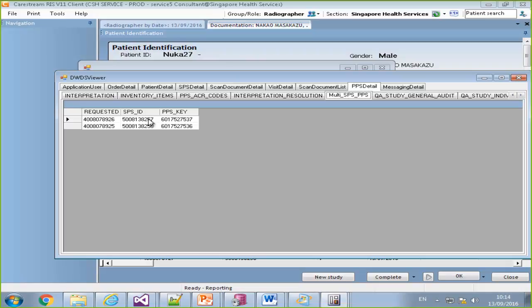In a lot of cases, the ones this is really important for, we use CT as an example here, but it's general X-ray that you really want to document together. It's your trauma series that you want to save your time on. CTs, you're not going to document those together so much. Even a lot of times, chest, abdomen, pelvis aren't three separate studies; it's one chest, abdomen, pelvis study that we'll document as one study. It's your general X-ray, where you're not documenting a lot of extra stuff, that this feature is really for. But again, you have to think of all scenarios of how it can potentially be used.